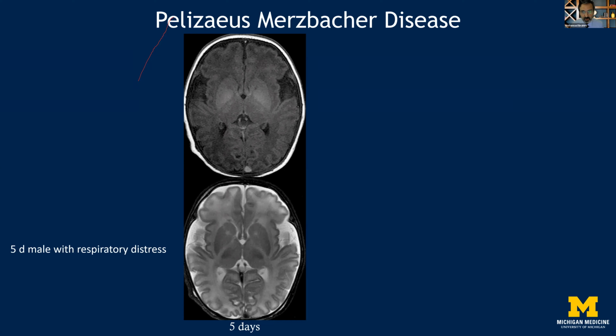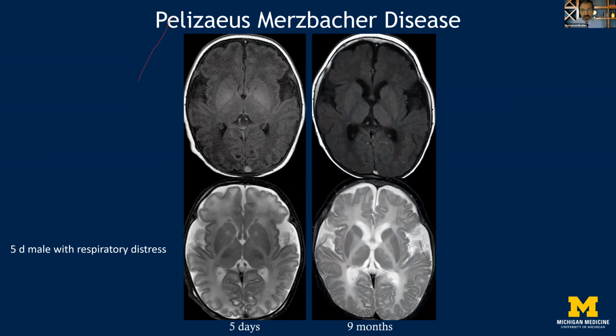The kid continued to have some structural abnormalities with hypotonia. When we imaged him 9 months later, you can see his cortical appearance has evolved. He's developing more sulci and increasing the complexity of his brain surface. However, his myelination milestones have not evolved as expected. It is, as a matter of fact, very similar to when he was first born.